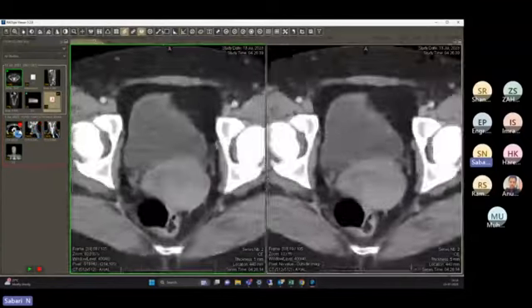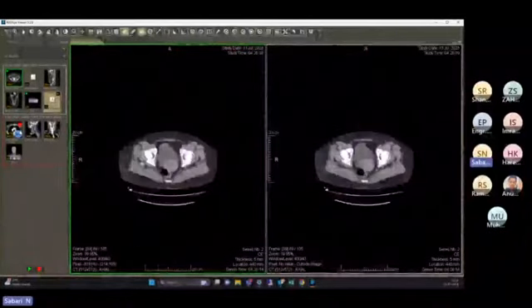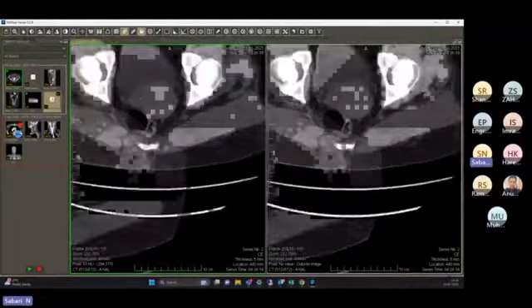In my application, the advantage is that whether it is a current image or a prior image, when I zoom the first one, the next tile will also automatically zoom. And another one is called pan. Pan is nothing but we can move the images wherever we want.